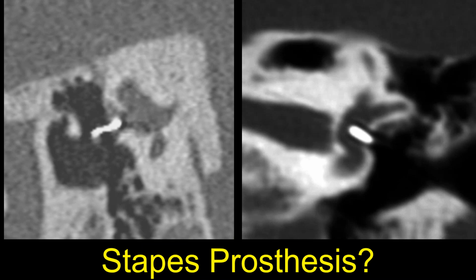So it's very difficult actually to keep track of which make and model we should see, how well and how far it should extend through the oval window niche and through the oval window itself into the vestibule. So we decided to kind of do a test to try to image these cases and see.